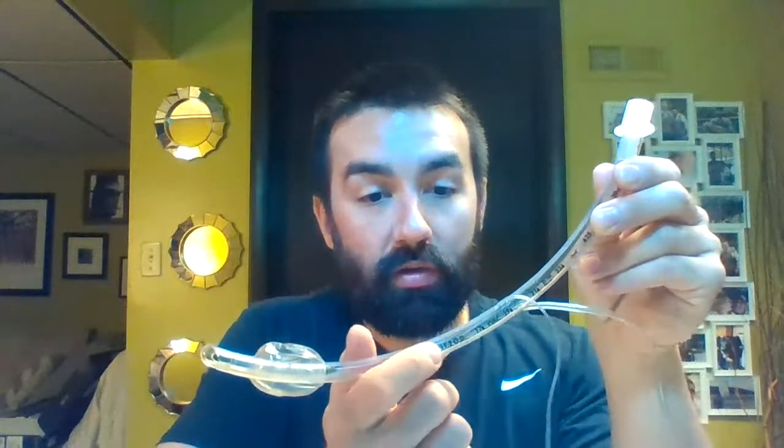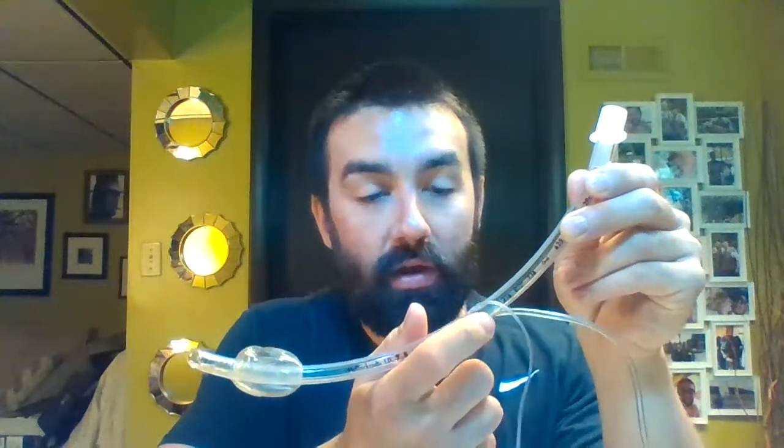Other things we have here: it's important to know that we have our units of measurement. There are little lines or little arrows that denote how many centimeters of depth we are. That's really important when we're confirming tube placement. They are also important to line up as we're maybe doing an ET tube exchange or suctioning, rescue cath, some of these different things. All right, so we've got our units of measurement.